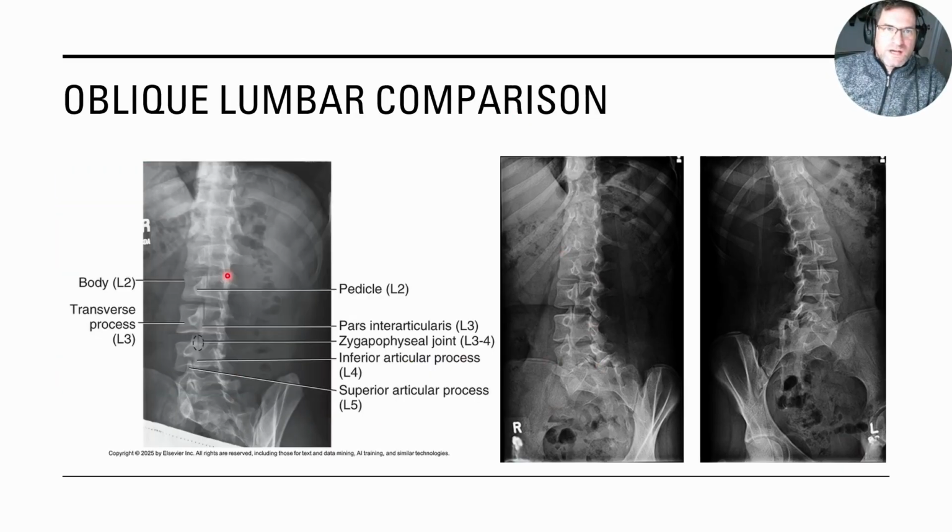On our comparison, you can see our L1, our L2, that we can still see the zygapophyseal joints, but when we start getting into here, because of that tilt that we have with the shoulders compared to the pelvis, we're missing it on both sides. So it was probably the patient, due to pain. You'll see it later when we go to the laterals. Otherwise, all pertinent anatomy is seen. So I would just say the exposure factors could be better, and collimation, between these two.